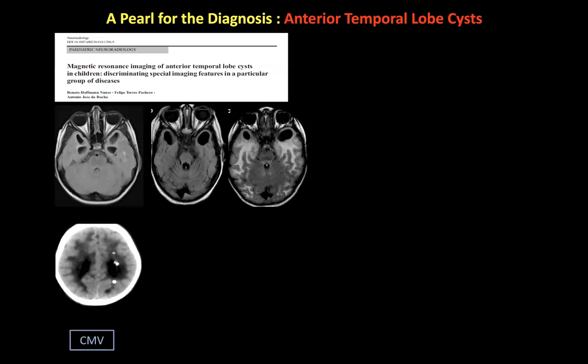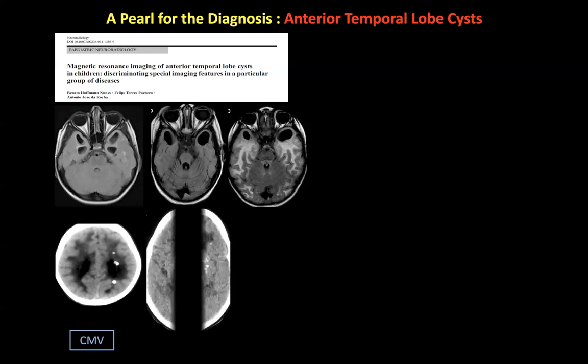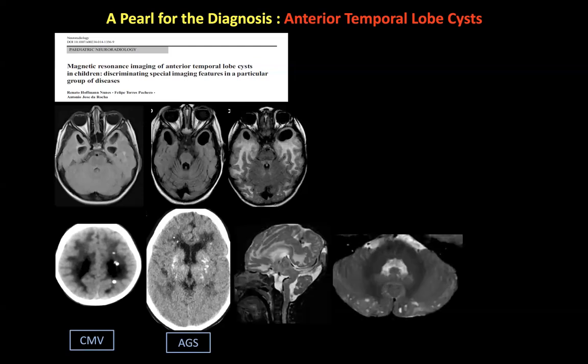If the child is very sick, very microcephalic, with typically basal ganglia calcification, think Aicardi-Goutières, especially in the context of associated leukodystrophy. If you have this very abnormal Z-shaped brainstem, cobblestone lissencephaly, and cyst, not only temporopolar cyst, but also in the cerebellum, think congenital muscular dystrophies like Walker-Warburg.